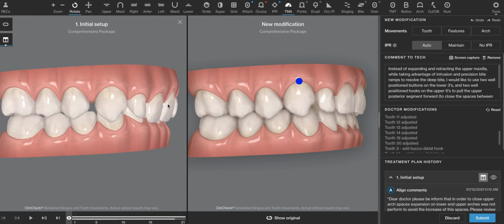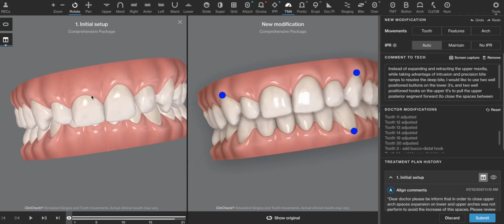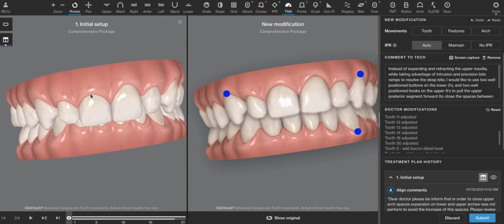Overbites present themselves in different ways. In this case, the patient has had super eruption of her anterior segment. Well, maybe not. I'm looking at the zenith of the canines and the relationship of the cervical margin of the central incisors. It looks like we just have some delayed passive eruption or delayed altered eruption on number 8, giving that appearance.